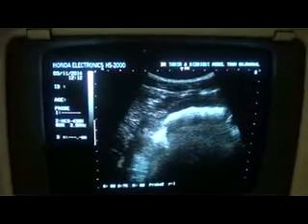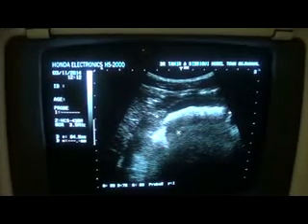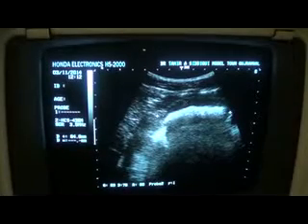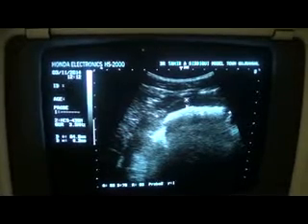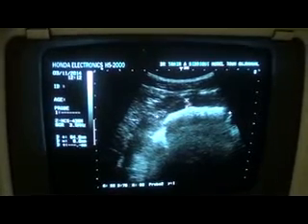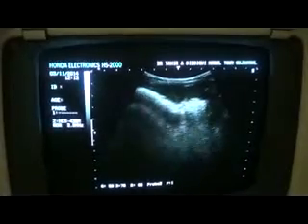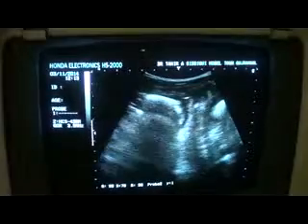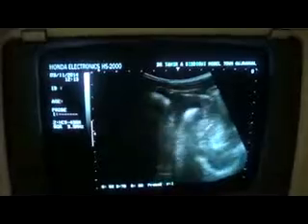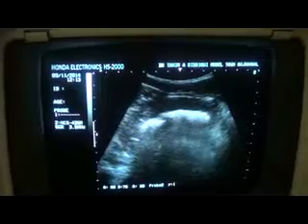And now see that this is a bowel segment with trapped gas within it. The bowel wall is regular, measuring approximately 6 mm. More than 5 is considered pathological. So there is a segment of bowel with trapped bowel lumen gases seen in the right lower abdomen. This is the one.